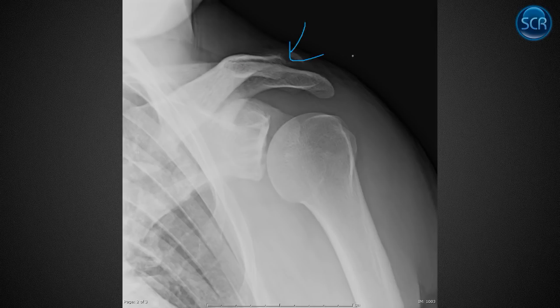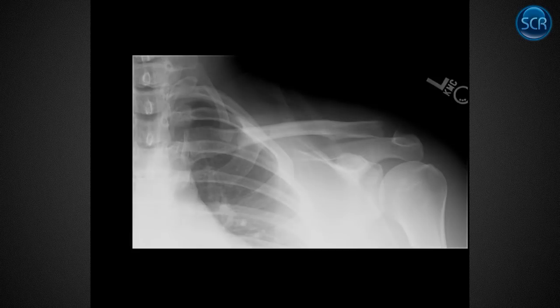So, osteolysis of the distal clavicle, also known as weightlifter shoulder, when it's idiopathic and related to exercise. This finding can also occur in inflammatory joint disease. If you have RA, psoriatic arthritis, even infection, that often affects the AC joint and causes osteolysis. So that's the differential. Could this be a weightlifter shoulder? Sure. You'd have to correlate with the history. That often is managed conservatively, and if it's inflammatory joint disease, of course, you need to see a rheumatologist.